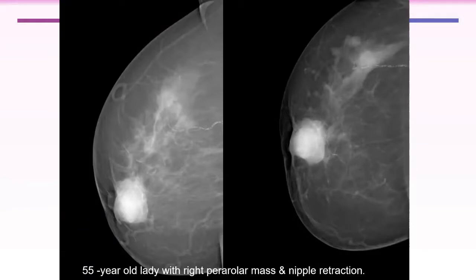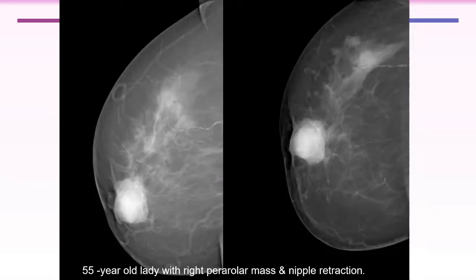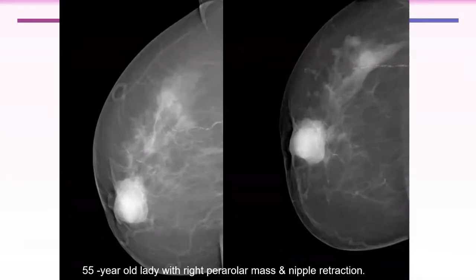Maybe, with what previous. We said we have to judge by the most suspicious features. Is there any suspicious features in this image? Nipple retraction and inversion, focal skin thickening. Yes. So at least this will be BI-RADS. Indistinct margin. I think it will be BI-RADS 4C. Yes. It will be at least BI-RADS 4B or C. At least, it will be BI-RADS 4. And so it is a suspicious mass.